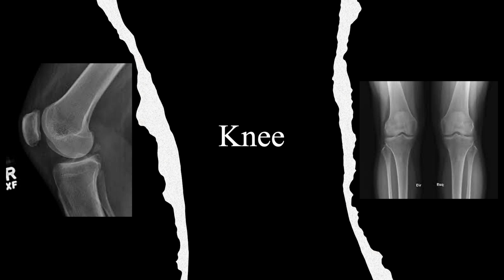And then on the lateral view, that would be here. So this is like a bent knee lateral view. You can get different ones, but you want to look at the suprapatellar bursa and make sure it's less than 5 millimeters thick. Very difficult to see this suprapatellar bursa. However, here it's right here. Again, it's more like an opaque strip between the two darker fat pads. Very difficult to see on some x-rays. Then you want to check the suprapatellar bursa for any fat fluid level.